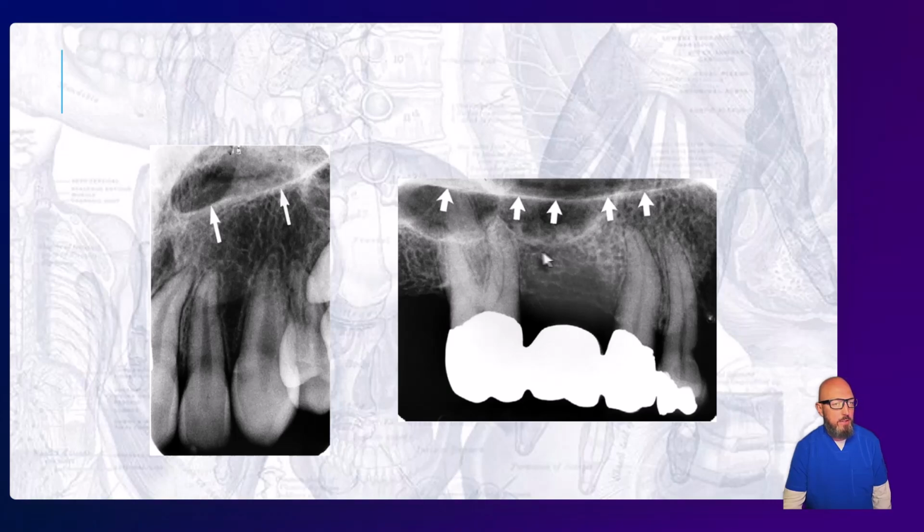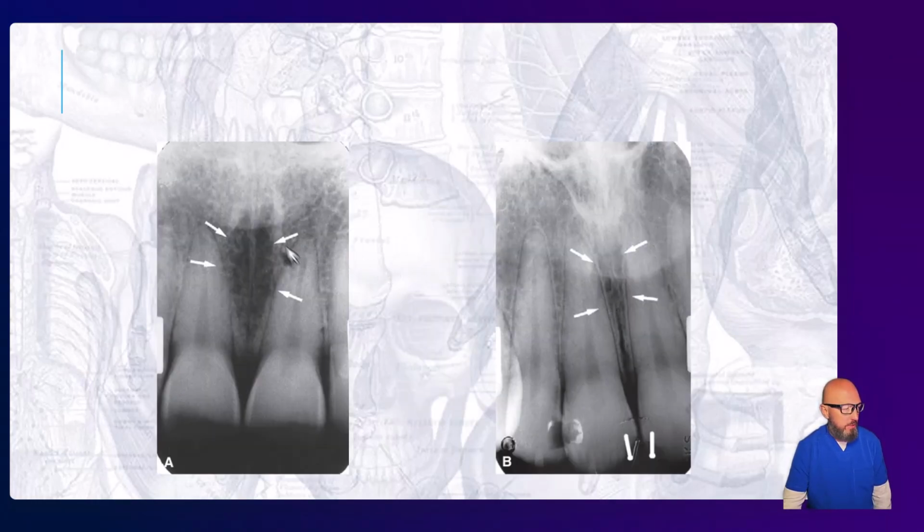And it's not the maxillary sinus, which we'll cover in a few minutes here, but this is actually the floor of the nasal cavity. You can also call it the hard palate line because it's 2 sides of the same coin. And then sometimes you'll see this radiolucent oval in between the 2 maxillary incisor roots. That's the incisive foramen, also called the nasopalatine foramen. It's the inferior opening of the nasopalatine canal, which we'll cover next.